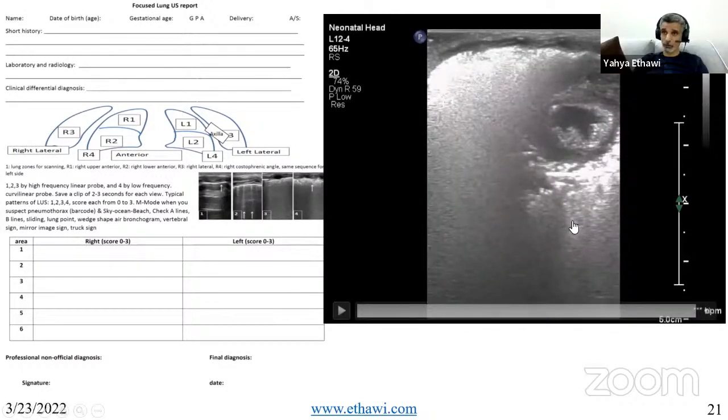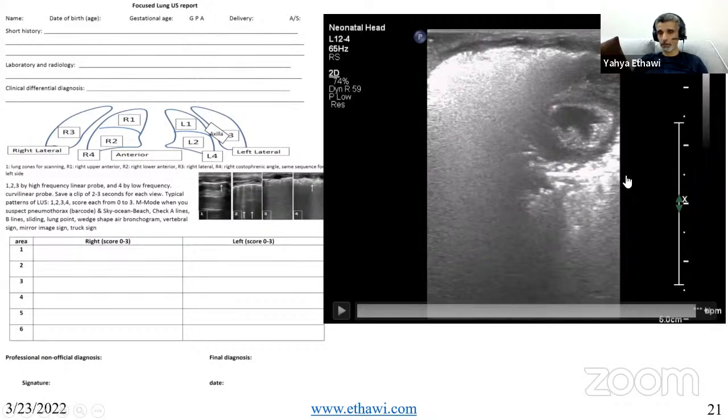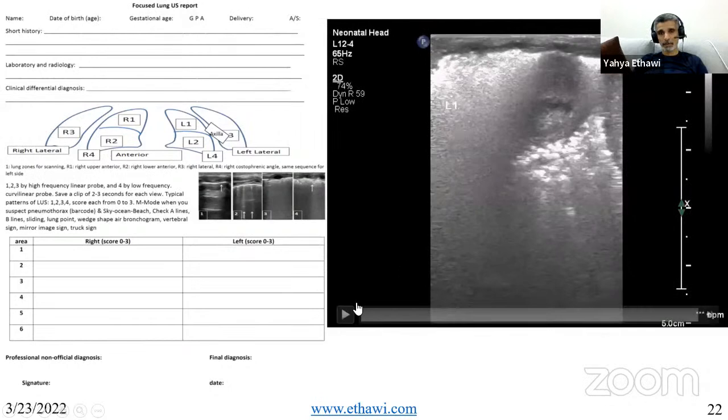And the reason why it's obvious is because it's not pneumonia. There is no clear boundary. It's more air bronchogram than fluid, and it's very echogenic, okay? It's clear here, as if somebody is increasing the echogenicity of the ultrasound. However, if you go here, it's only pulmonary edema. So it's only these areas that have this echogenicity. Again, it's very interesting.